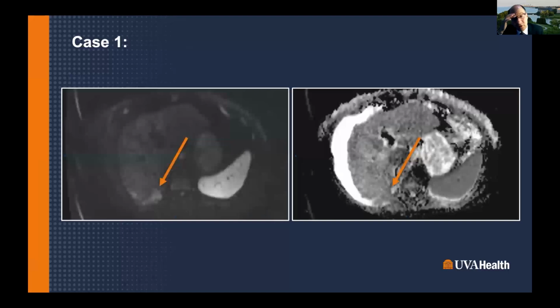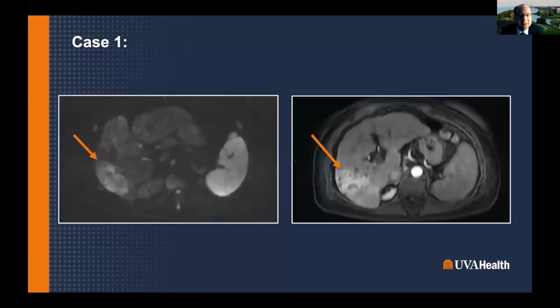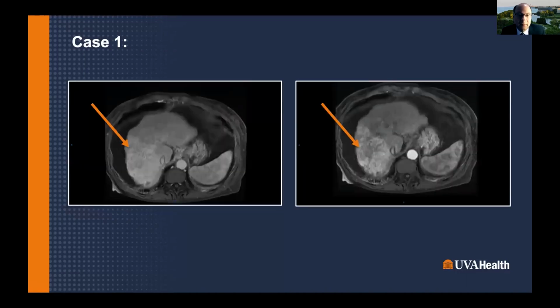Yeah. The first one you showed, I thought was outstanding because these infiltrative tumors, even without treatment, are hard to assess. They're hard to find the tumor. Certainly, I thought that the enhancement in this example you nicely illustrated, the diffusion was really helpful. Initially, as you show on the slide on the left, there's a lot of restricted diffusion. It's enhancing. And then the next slide shows it's still enhancing, so it's hard to assess therapy because it may not wash out, but I think you nicely illustrated it.